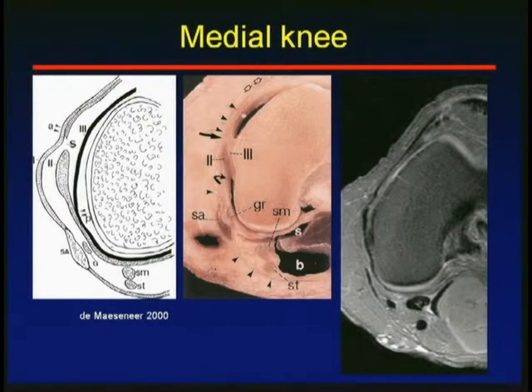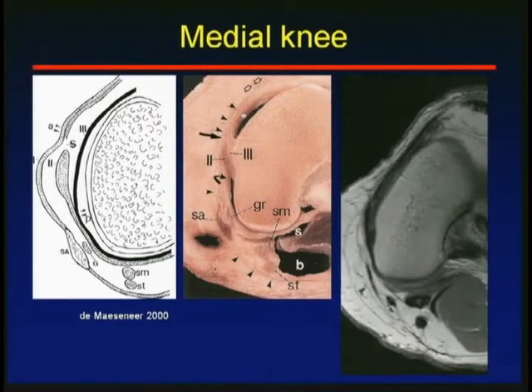So you can usually recognize these structures on your axial images, and a good landmark to use is where the femur turns. And that is the position where you should be able to see your tibial collateral ligament. It's usually at or just around the corner. And it's this first centimeter of tissue, this thickening that you'll see in that region.